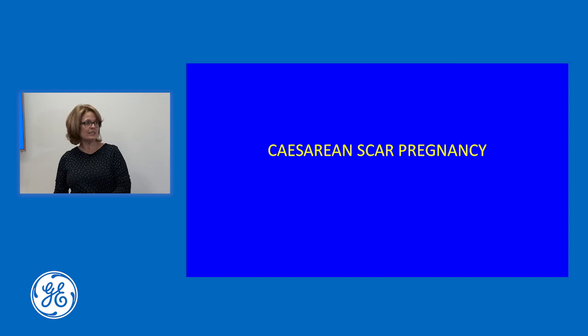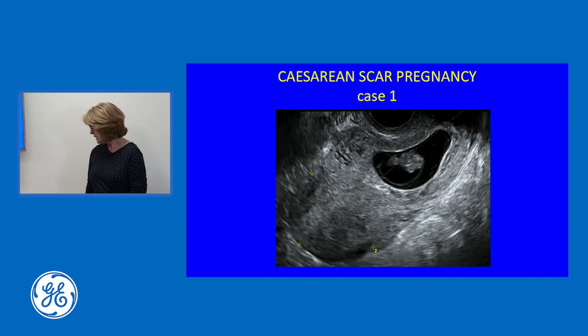Caesarean scar pregnancies are really important to diagnose. How many of you have heard of a caesarean scar pregnancy? Have you seen any? Have you diagnosed them? Excellent. This is one example of a scar pregnancy.